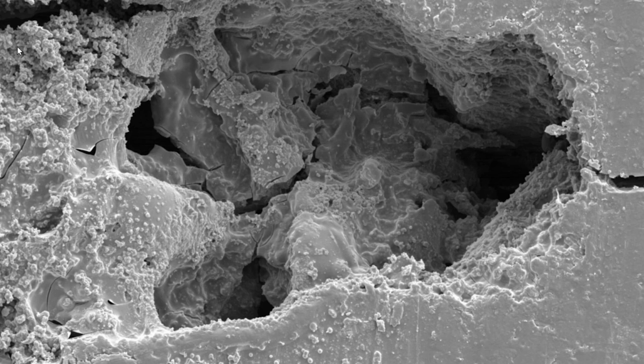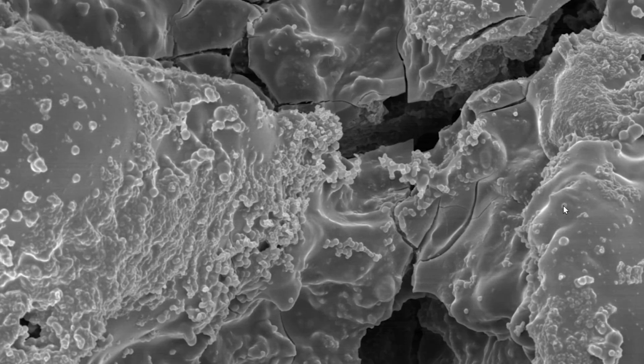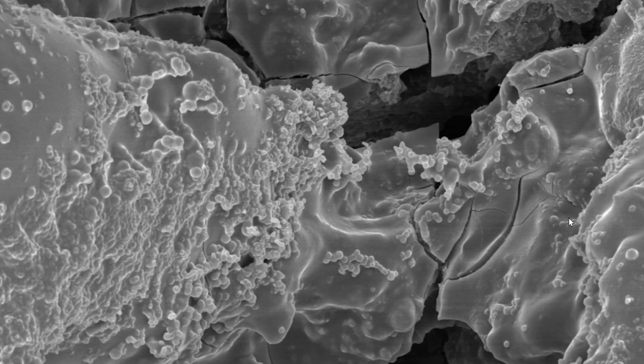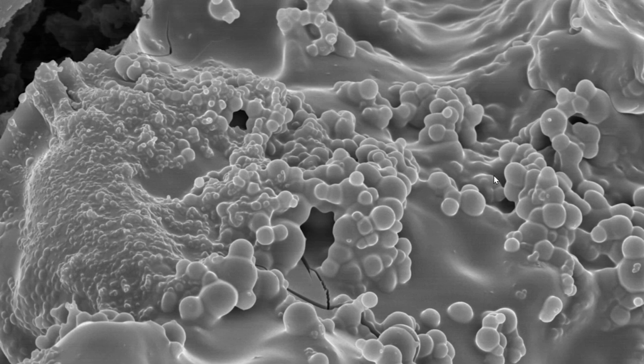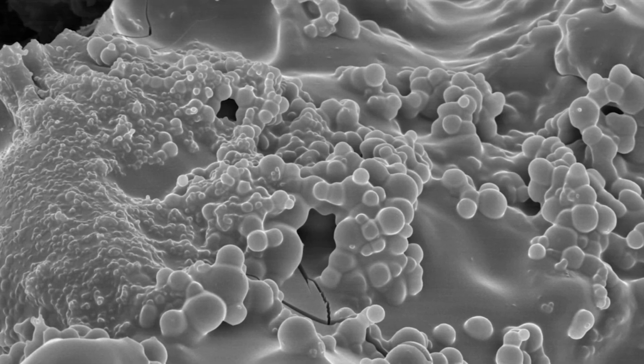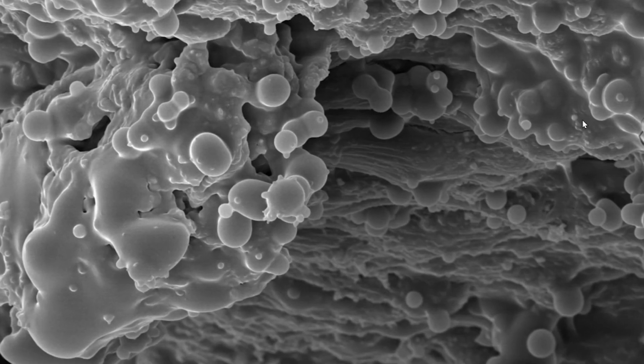We're going to look at kind of along the axial wall there and right into that glassy looking material. And you can see it's a very ancient biofilm, mostly EPS, but there are organisms budding off from that area. So this has probably been there for years and years and years.